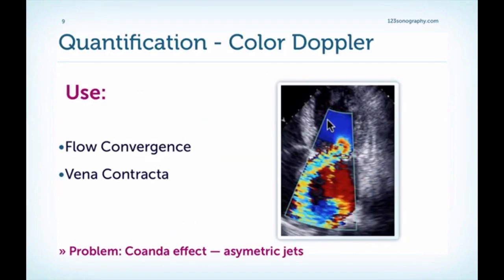How does the jet look in echocardiography? This is a still frame where you can nicely see all the components I just described. The proximal flow convergence zone, the vena contracta, and the jet body, where we could actually measure the width, the area, and the length. Not really in this case. Why?